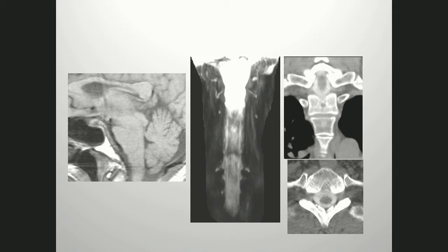This is a different patient who was transferred or referred from another hospital, and he comes with some cognitive issues and a frontotemporal type of presentation. And brain MRI was done, and it's quite abnormal. Again, you see the pontine abnormality, enlargement, the distortion, the mammillary body, the distance between the top of pons and mammillary bodies reduced. We'll look at that. Numerous blood patches were not effective.